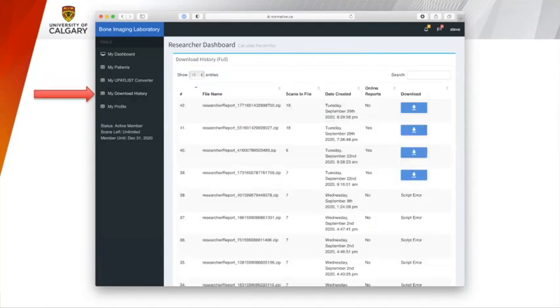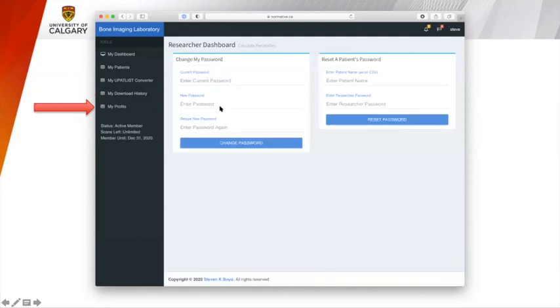It also shows you the number of different times that you've run analyses on it, and you can go and find some of those analyses. We were doing some debugging, and that's why we see some script errors here, but those won't matter anymore now. And you can change things like your usernames and password. That's your personal username and password, and then you are in charge of your subjects' data, and each of them may have a username and password, and you will be given those automatically when the analysis happens, but you can actually change them as well.